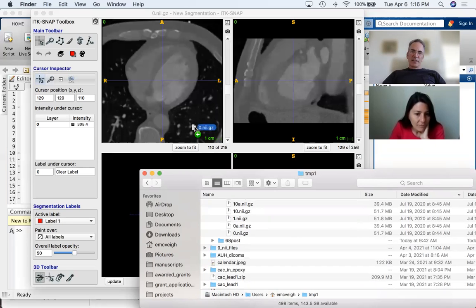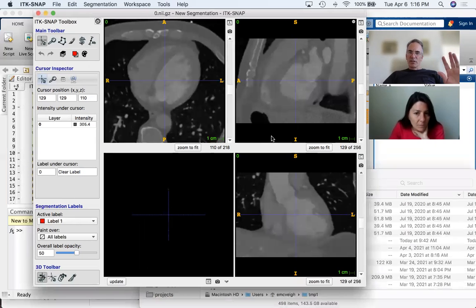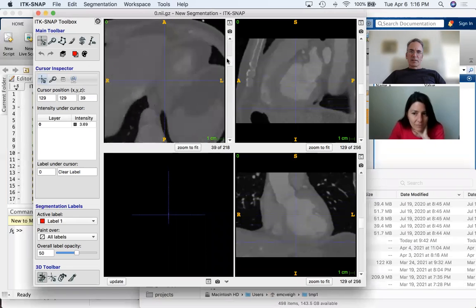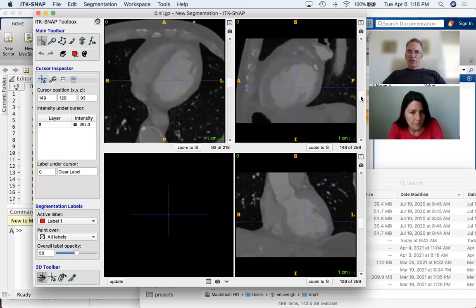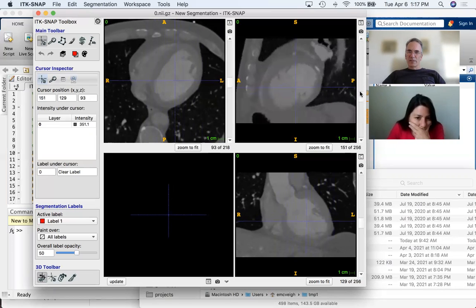So you copy this into, just make sure everything's good. It looks good. You can go up and down the slices. It looks like a really nice case in that there's no leads, right? In the pre, I don't know what that is. I don't think it's a lead. Maybe it's just a lesion, a big lesion. Up and down. Okay, so everything looks good.